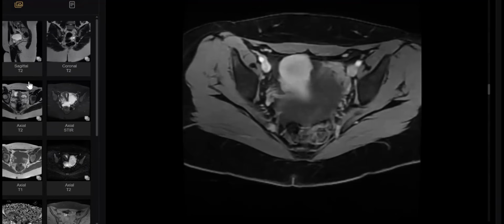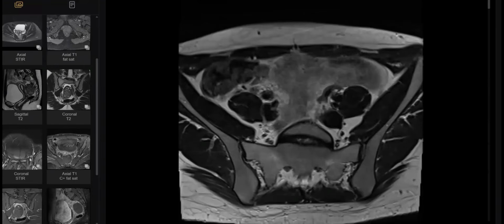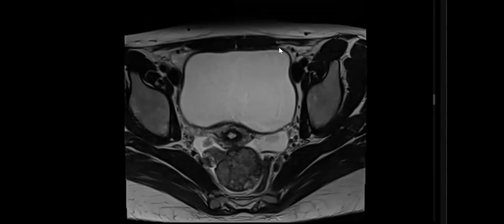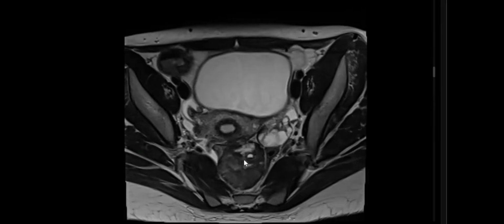So till now, the first two cases are early. What about the last case, my friend, acute pelvic pain since 2 days. The uterus is unremarkable, with an abnormal structure posterior to the uterus.